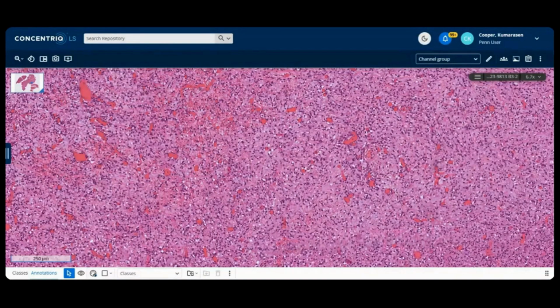S100, CD34, neurofibroma. Yeah, you're right. You're spot on right. NTRK rearranged. Right, there you go. Okay, Mohammed. Spot on. Yes, thank you. That's what this was. This had to be sequenced and proved to be, I think it was the recurrence that was sequenced. I don't know what the primary was called, and NTRK fusions. I think it was sequenced and the NTRK rearrangement was demonstrated. So this group, as you all know, is no longer sort of emerging, it's well recognized. Yeah, NTRK rearranged spindle cell neoplasm.